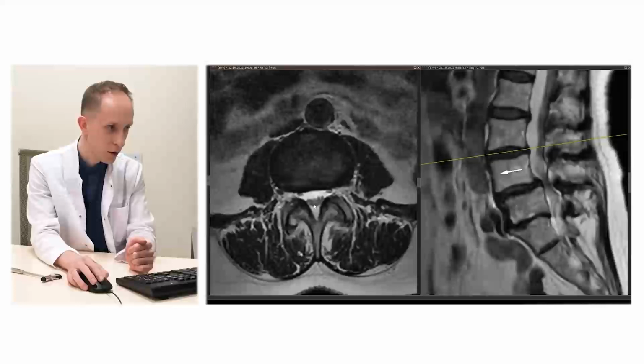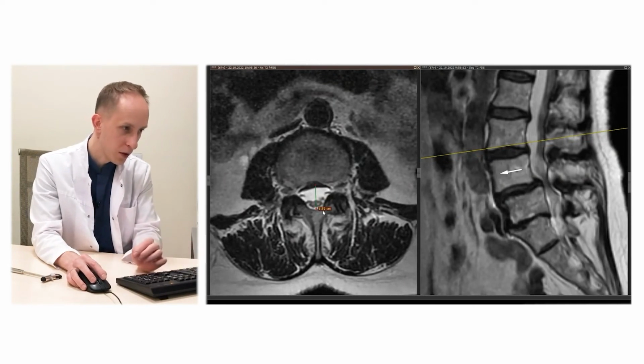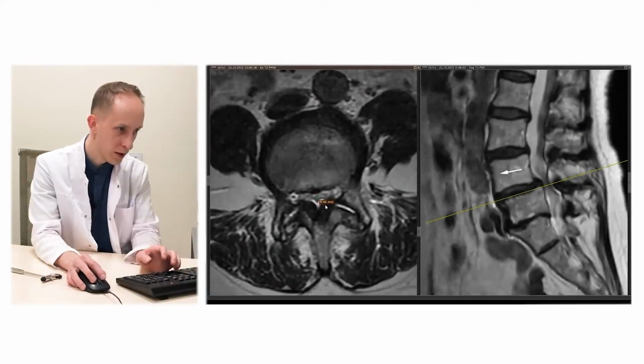And you see, here is a fairly wide spinal canal. Yes, here we can measure it. It turns out the distance is about 15 millimeters. Here they are, the nerves are all lying loose. And look at what is happening at this level. At this level, the spinal canal is significantly narrowed, the nerves are compressed here. If we measure it, the distance here will be about 4.5 millimeters.